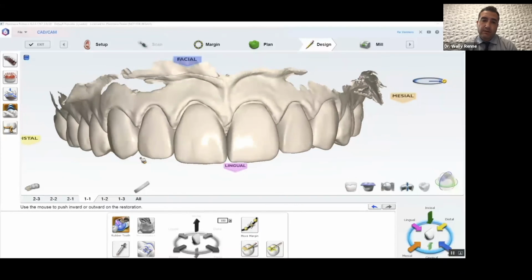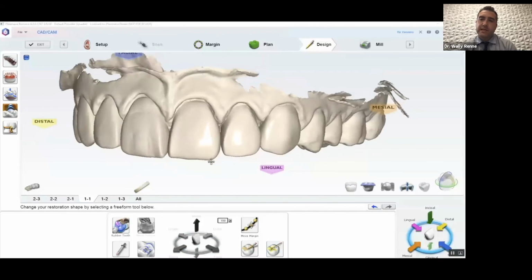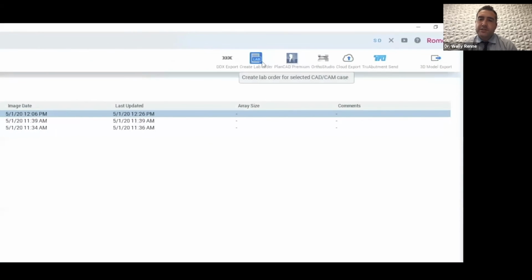Here we have a large digital wax up. So we have, in this case, 6 units that I'm sculpting for one of my patients, and I'm going to go ahead and 3D print this model so that I could transfer it to their mouth using a putty wash technique to basically bring digital into reality for them. So you basically design in this instance, and of course we'll talk about how to digitally design like this using Smile Design parameters. And it just keeps going, and there's nothing you cannot do.